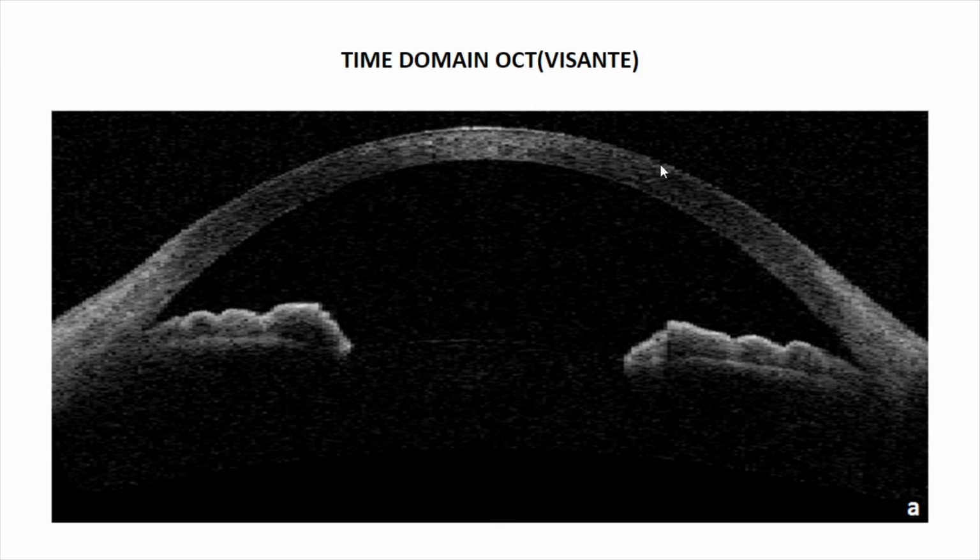Can one of the second years interpret this? This is an axial time domain OCT scan of the eye, in which we can see that the corneal anatomy is within normal limits, and we can see the angle structures. It appears to be of normal depth. That's all? The iris can be seen and the lens. No, you have to tell what is it, open or closed angle. Open angle. Okay, so you have to describe the entire frame. What are all the structures you are seeing, whether the scan is of good quality or not.